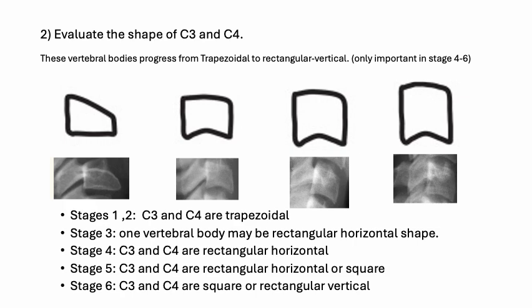And in some papers, they'll actually define it by measuring the anterior border, and some they will define it by measuring the posterior border. There definitely can be a difference between the two, even when it's not technically in this rounded off trapezoidal shape, because depending on the projection and the rotation, the posterior border can look a lot taller because you can't really differentiate the posterior border of the vertebral body from the uncinate process. So I think that the anterior border is a little bit easier to see in the later maturational stages.